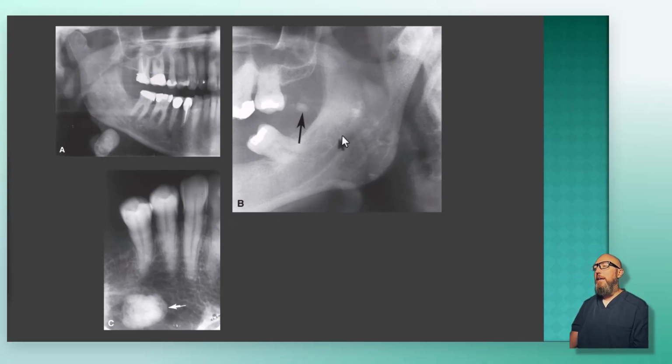All right, what about right here? This location, kind of anterior to the ramus, you might be thinking tonsilloliths, but this is following a line extending forward from the parotid salivary gland. And so this also is a sialolith. What about this one? Floor of mouth, kind of occlusal. That's also a common location for a sialolith. It is well defined and smooth, a little bit heterogeneous inside, but that's okay for a sialolith. So all three of these are sialolith examples.